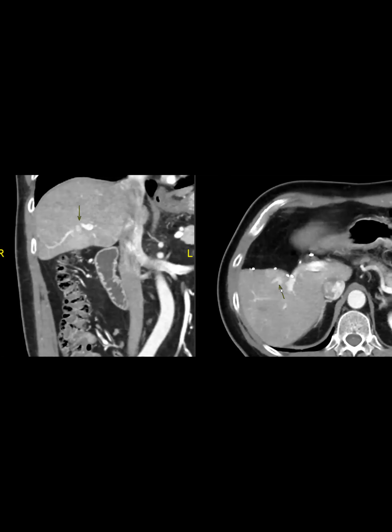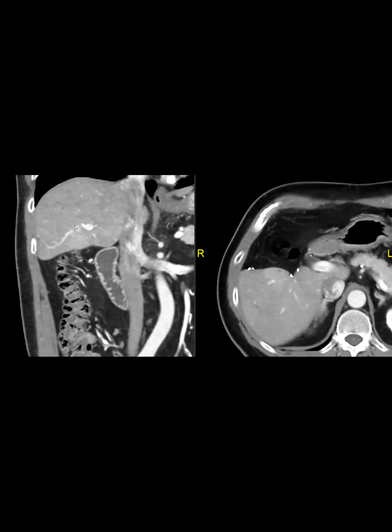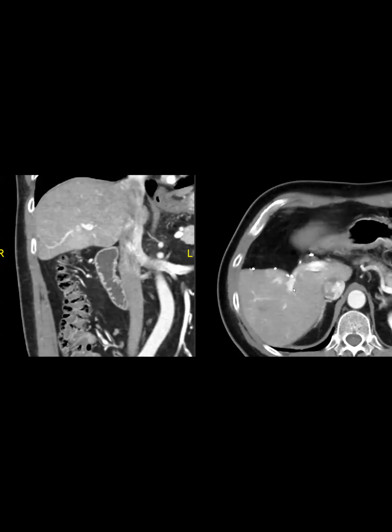An actual little lesion. Now there's no washout, but it's a real lesion. I looked it up, looked carefully, and you can actually see it a little bit on the delayed phase. So it was a real lesion, it was LR4. But I guess the teaching part here: if you see a new little focus of enhancement and perfusional changes, they come and go, and it also depends on the exact timing of our contrast phase, so it can certainly change.